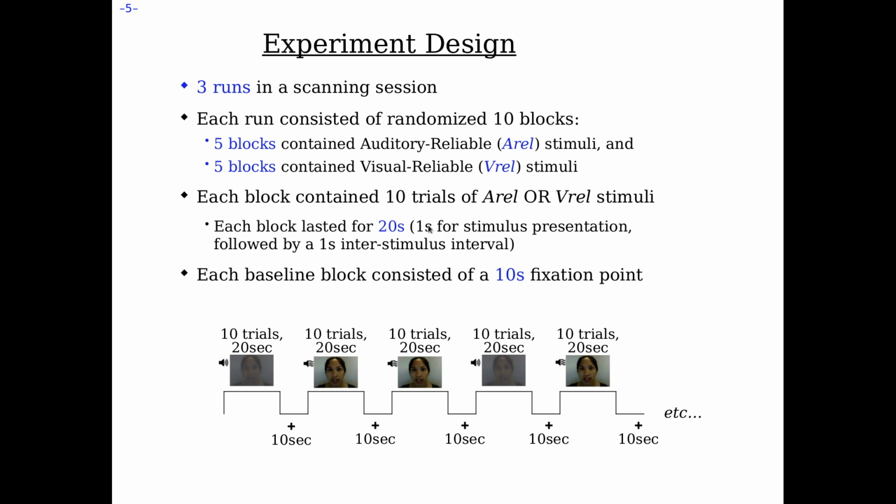But it's basically 1 second on, 1 second off. If you ignore the minor fluctuations, you can pretend this is a 19-second stimulus or maybe a 20-second. We'll just be simple in this case.